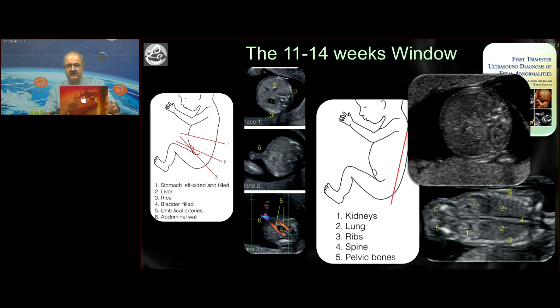And if you're using some of the newer equipment, and if you're using harmonic imaging, you will often find that the echogenicity is almost identical, or the kidneys might actually appear more echogenic at this stage. So if you have any doubt, just switch off the harmonics and see what is going on, or use an old-fashioned transducer and see whether they're truly echogenic or not.